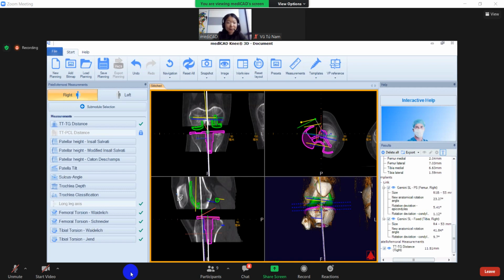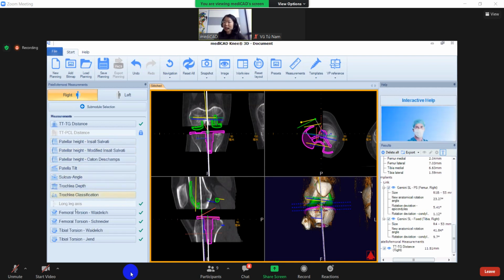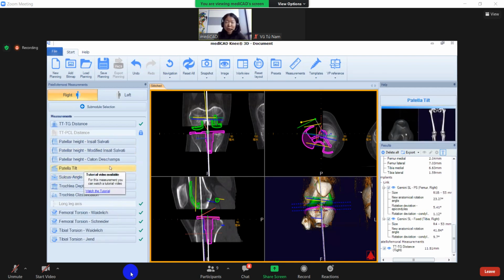I think in the hospitals, knee and hip is more common. Okay. But you are not using it here. Okay, so I will show you the measurements here. I will show you all the measurements here, and then we are going to move on. Okay?